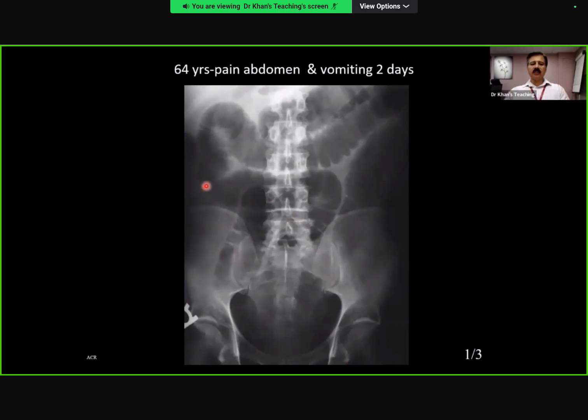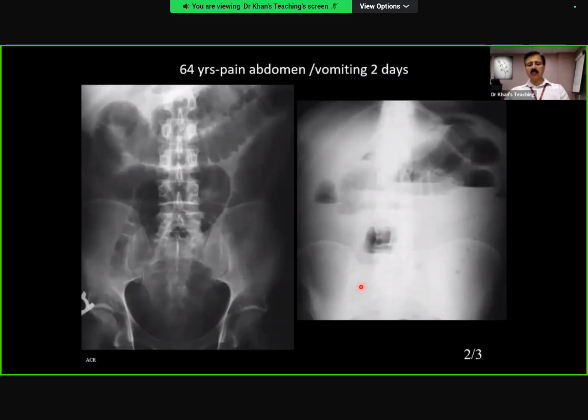And if you see here, this is small bowel. Actually, there might be something here, but if you see, there is nothing in the rectum. So beware of severely dilated gas-filled small bowel. And the learning point is to differentiate between valvulae conniventes versus haustra. The same case, I am showing you an erect film. As I told you, there are no chances of you getting an erect film. But if an examiner asks you this question, this film will help you.